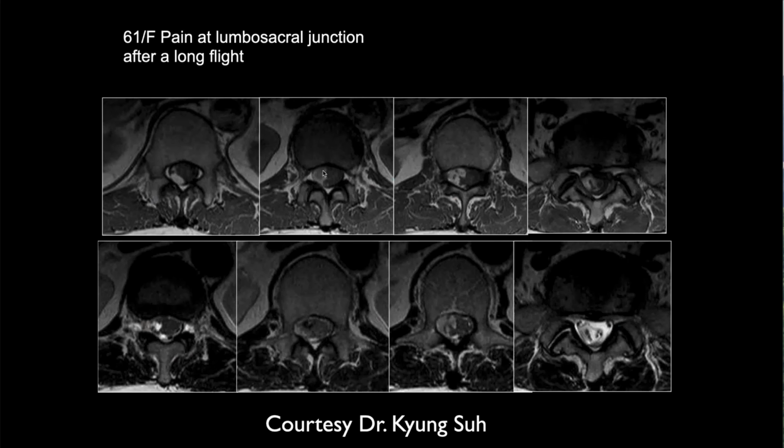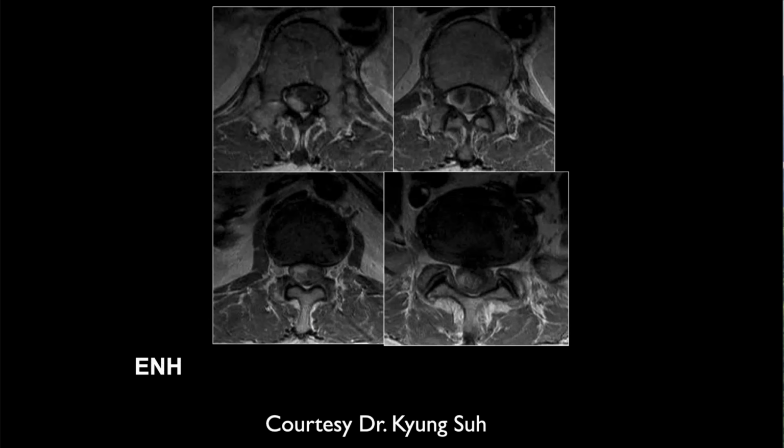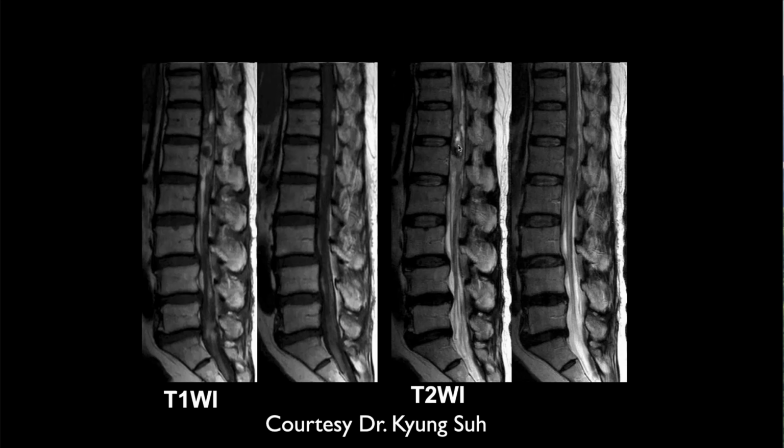Okay. And then if we can look, enhancement, there's really, again, we don't have pre and post, so we don't know whether there's enhancement or not. There are the sagittal images. What do you see here? So it's intradural.